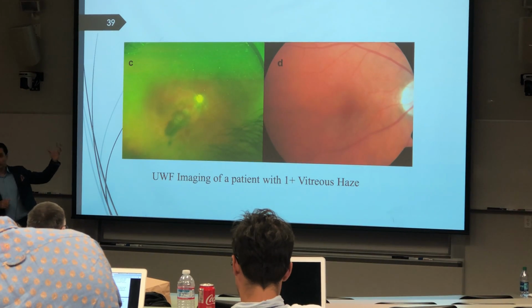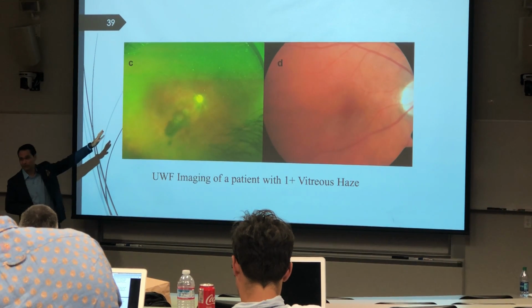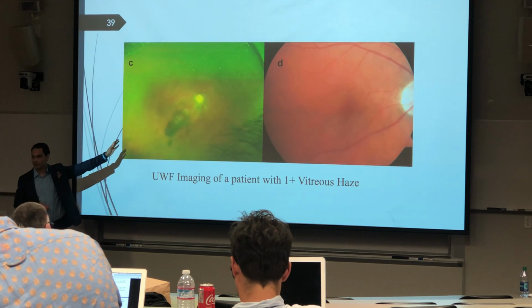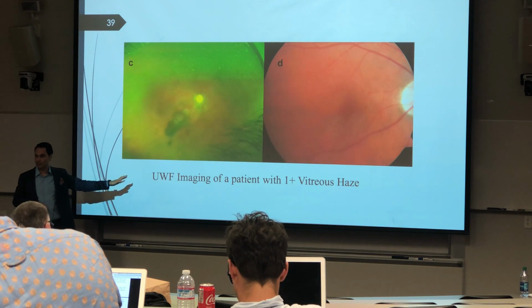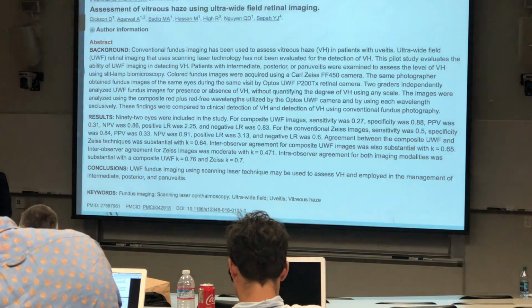And then when we started looking for that localized haze, we started identifying vitreous haze. What we see here is a lot of dust and a lot of artifacts, but it is not vitreous haze. The vitreous haze in Optos actually just sits in there. You can see it. If it is there, you will see it, located in the vitreous at that point.